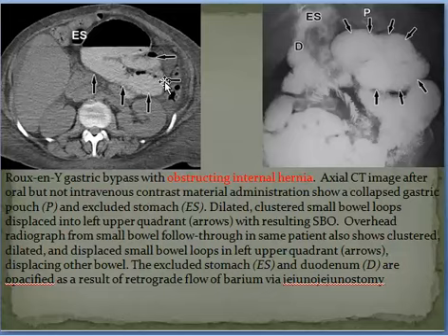This is the jejunum, dilated jejunum. It is still displaced into the left upper quadrant here with these arrows around. So this is the displaced part of the small intestine, the jejunum, the Roux limb, denoting small intestinal obstruction. This is a paraduodenal hernia.